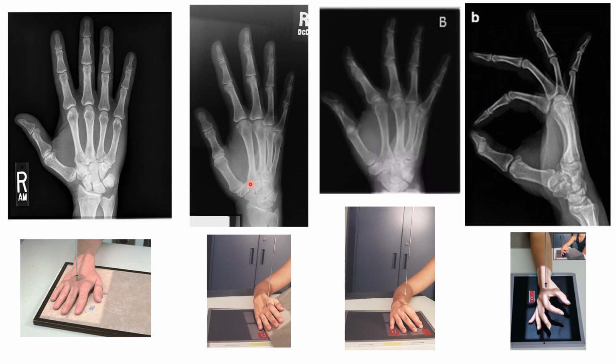But we can look at the metacarpals and see that this image labeled B, compared to this oblique, is not rotated as much. You can kind of see it in the carpals too. Down here in the carpals, you can see more overlap of the carpals because the wrist is rotated more.